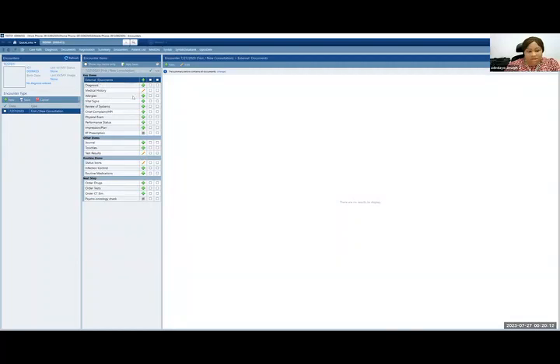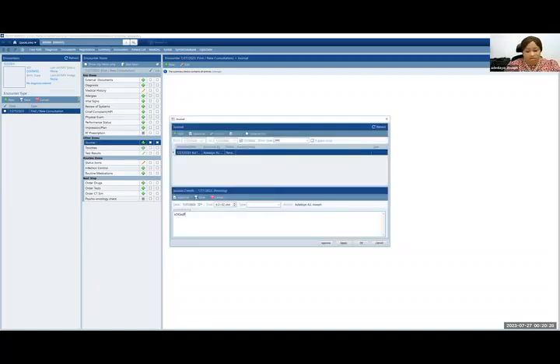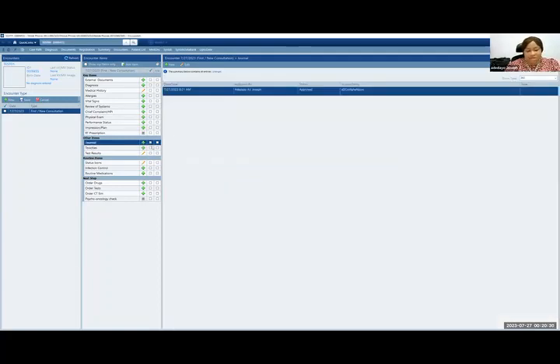And then these are all the EMR items that you go through. When you complete an item, so let me just take the journal and use this as an example. If I click here, and I'm just going to type some jargon here, and I approve it, it will automatically check that column to show that that encounter item has been completed. So at the end of the encounter, if this is all I completed today and I close the encounter, it will show that all the other items were not checked.